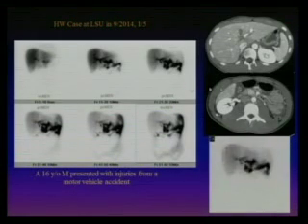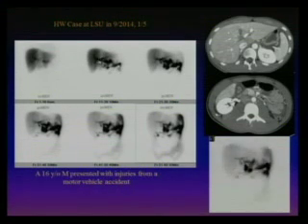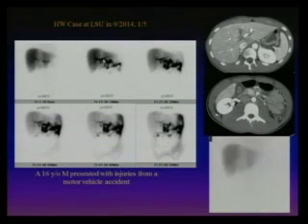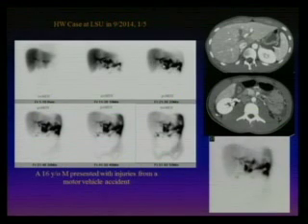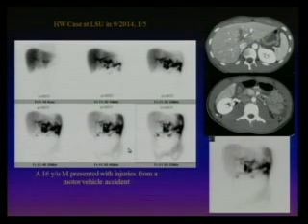And then you need to follow this again. Where is it? So this is probably the left intrahepatic duct. Yes. And then you go here, and what's this? It says leaking from the left. Yeah, so this is the leak tract. They go from this left intrahepatic duct and connect to this abnormal tracer focus, and then eventually they spread into the abdomen. So that's what we told them.